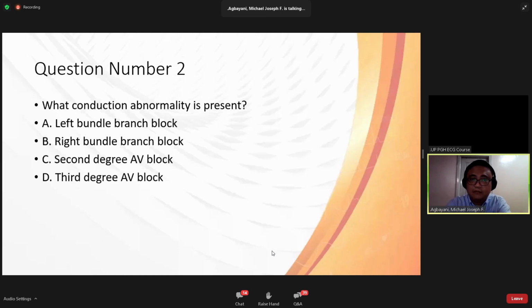A, left bundle branch block. B, right bundle branch block. C, second degree AV block. Or D, third degree AV block.